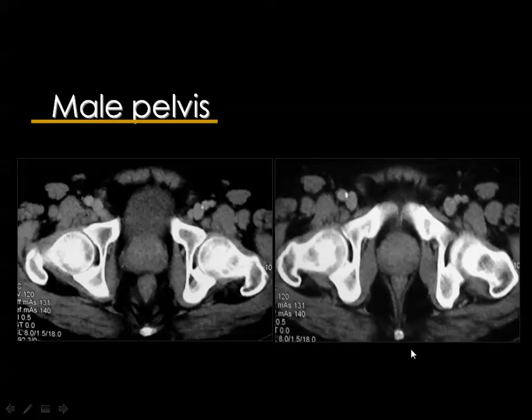And lateral to it, you can see this triangle, which is filled with fat, and this is the ischiorectal fossa. And this is, of course, one of the famous muscles in the pelvic floor. This is the obturator internus muscle, and this is the prostate, as you know.